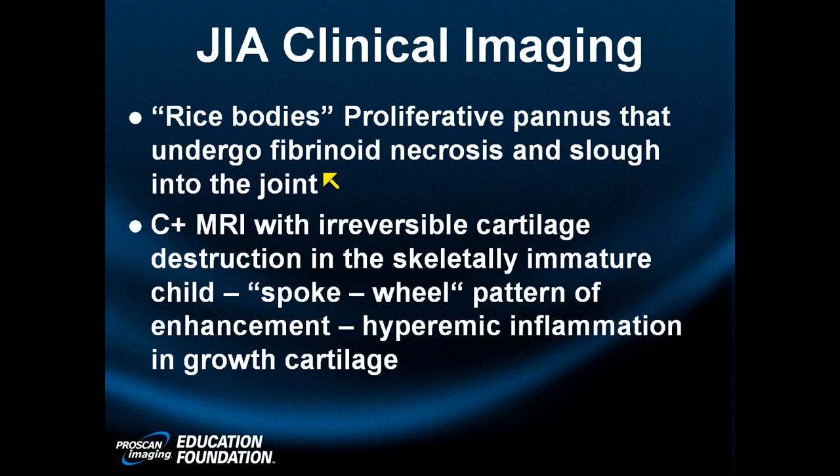So they look like rice. They're very small, they're gray, they're not going to be as black or as big as synovial metaplastic bodies or PVNS. Some people use contrast MRI to look for inflammation.